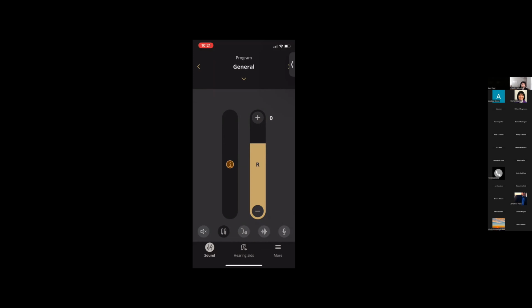So it can have a varying effect. Essentially what it does is it reduces ambient noise. Sometimes this works. It doesn't work for lots of ambient noise, but it does work for just a little bit. That little hum from the restaurant gets a little bit easier to deal with. I'm not sure how this technology works, but it does work. You can toggle this on and off.